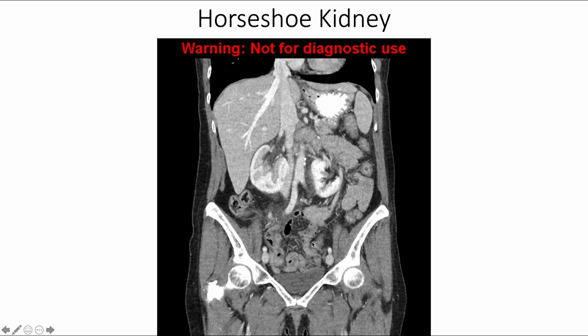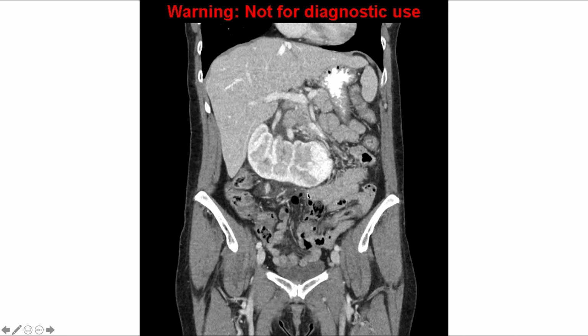The next case would be the horseshoe kidney. In this condition, the patient's inferior poles of the kidney fuse, and the kidney then ascends from the inferior abdominal and pelvic cavities. So here we can see two poles. This is a posteriormost view, two poles of the horseshoe kidney, and as we move anteriorly, we'll be able to appreciate the fusion.